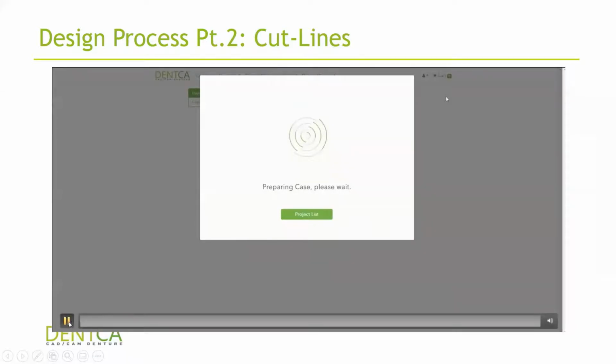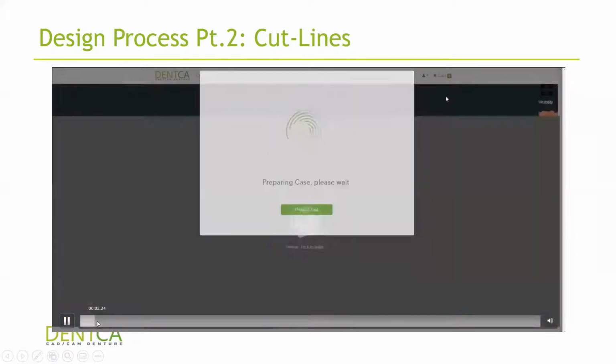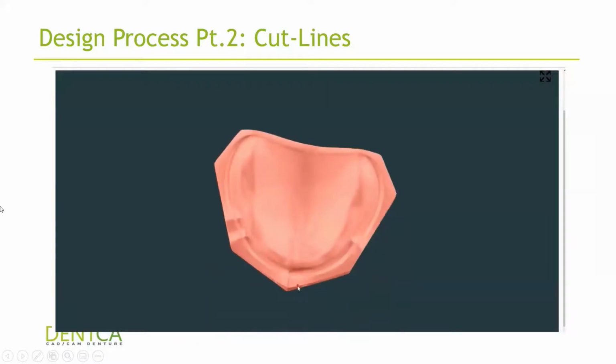So here we can see a video. It's very simple to do. All you have to do is hold control and start clicking where you want them to go.